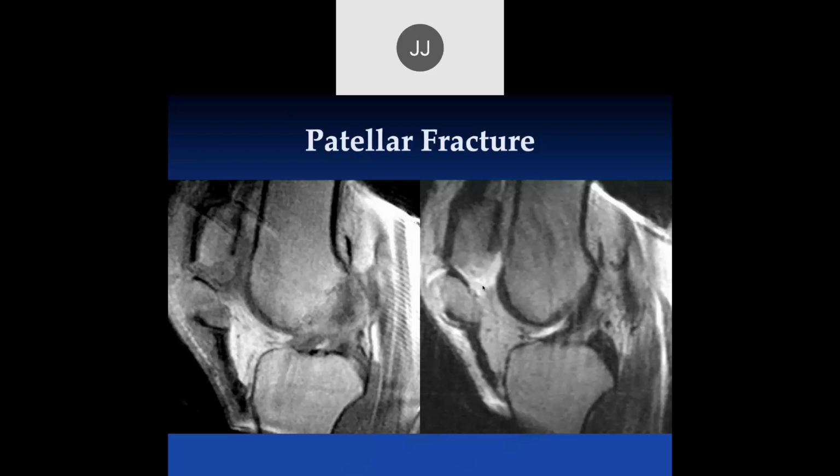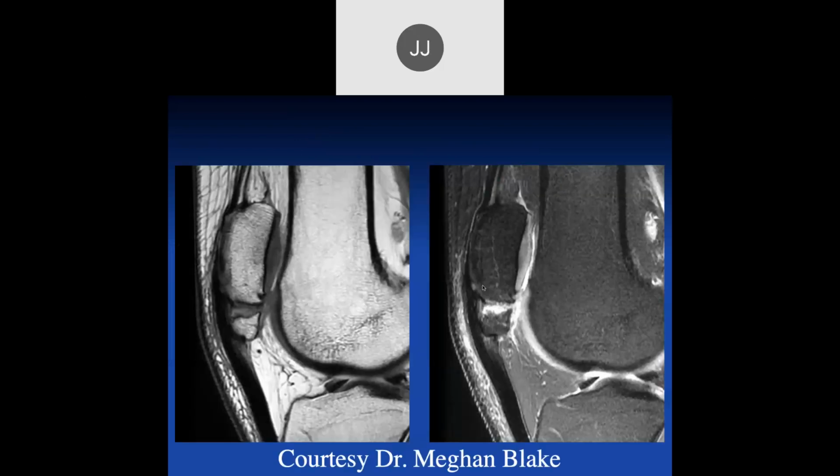Okay. So you treat this surgically. Yeah, you cannot treat this any other way that would work. Yep. This is definitely a surgical procedure, and so is this one.